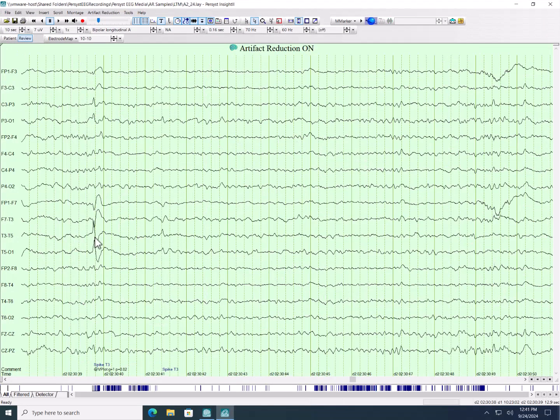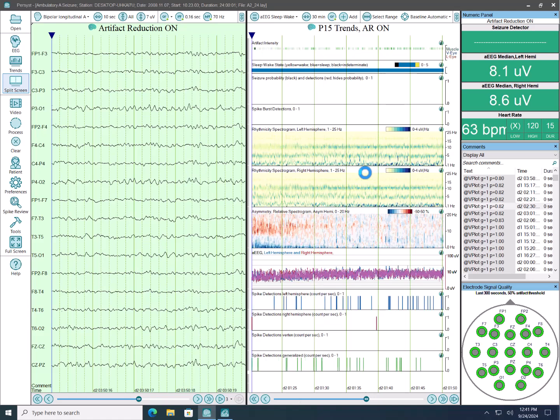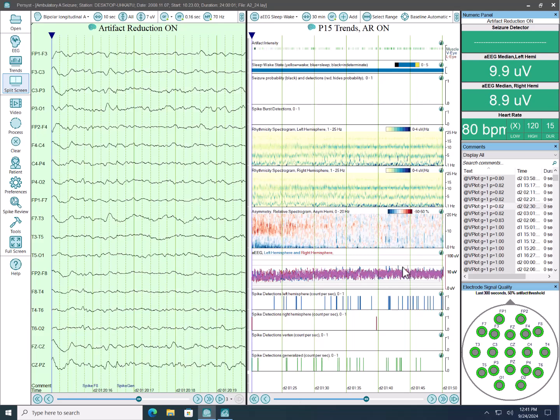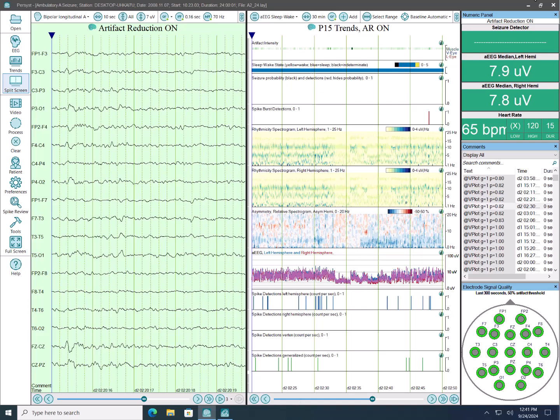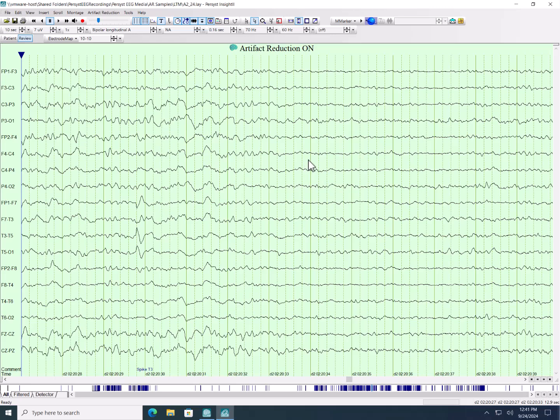So it's taken us to this part of the recording, and as you remember, looking at the trend display, we also have some seizures here. So prior to the seizure, we see some of those left temporal discharges, but we picked some from throughout the record that were exemplars. Let's go ahead and minimize that out of the way. And what we had done is we had selected the Insight 2 button. Now there are a whole bunch of buttons up here. It's the same program, and it synchronizes together, but the important thing to keep in mind is that this one gives you an additional set of tools.